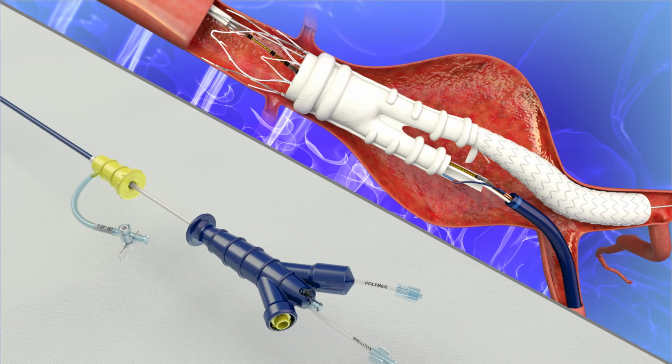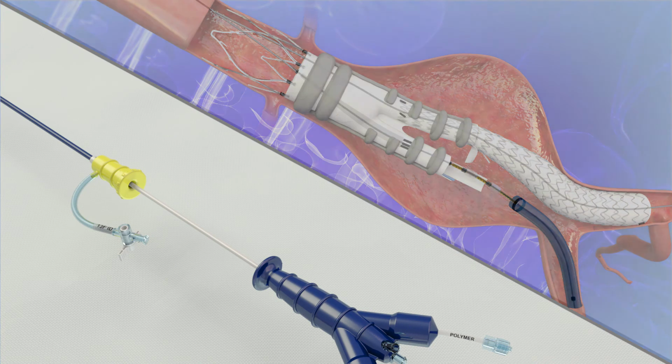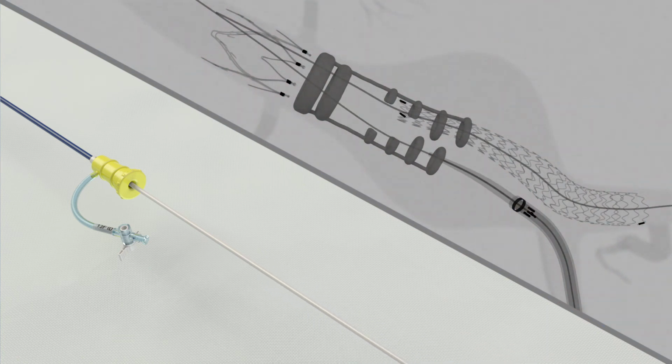Retract the inner catheter until the fill lumen disengages from the stent graft. Reseat the nose cone into its outer sheath. If the integral sheath will be used, withdraw the aortic body delivery system while keeping the guide wire and integral sheath in position.